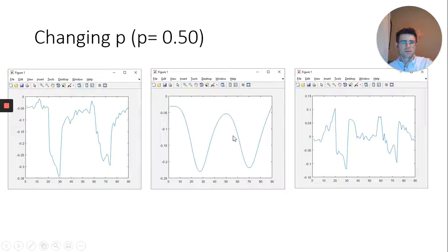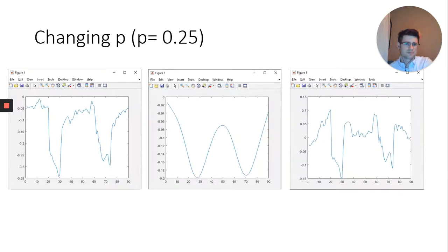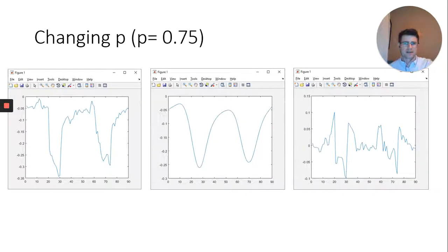So we're going to go to 0.5. So here we go. Here's the original data again. I've added a little bit more of a flat line here. There's a little bit of a shift up here in the 2 minimums. And now you're seeing it's comparatively slightly less extreme. We're getting there. Still not great. Let's see what 0.75 gets us. Okay, so now you can actually start to see a mean here, right? Actually start to see a little bit of a mean value. There's some variation still present, but it's starting to kind of regulate in a way.